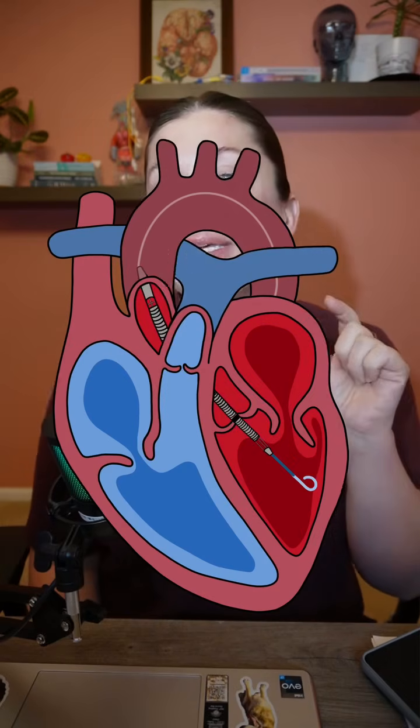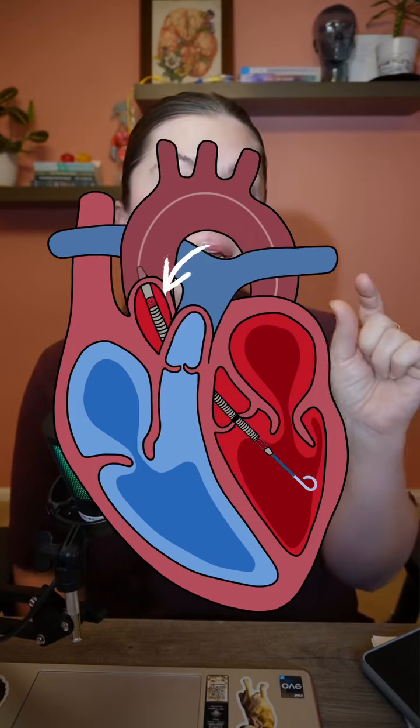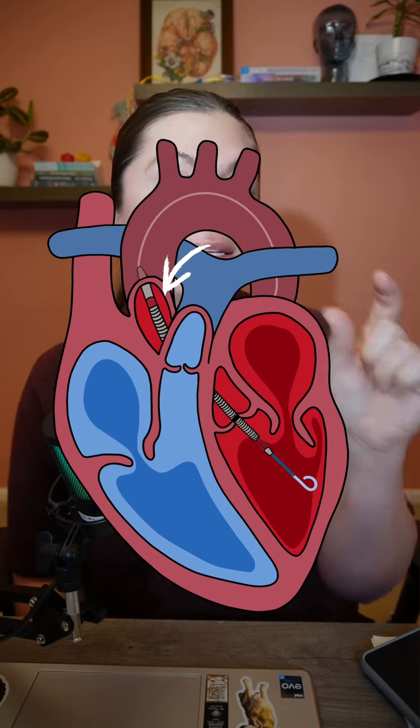This signal pretty much gives us information on the location of the fiber optic sensor in relation to the aortic valve. When the Impella device is in proper position, the fiber optic sensor as well as the outlet cage is going to be outside of the aortic valve, sitting in the ascending aorta. If for some reason the Impella device is in an improper position, such as being too far in, so now the fiber optic sensor as well as the outlet cage is in the left ventricle, we are going to see a very different waveform.